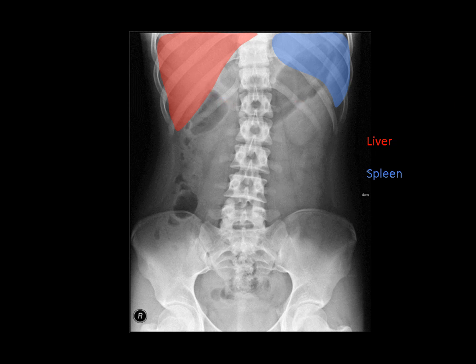And it's important to know that it's not abnormal if you can't see these structures. This patient is a pretty good example of being able to see a lot of the soft tissues, but very often due to various reasons, technique, quality of the study, position of the bowel and overlying bowel gas, it can be very difficult to see these structures, and it doesn't mean there's an abnormality if you can't see them.